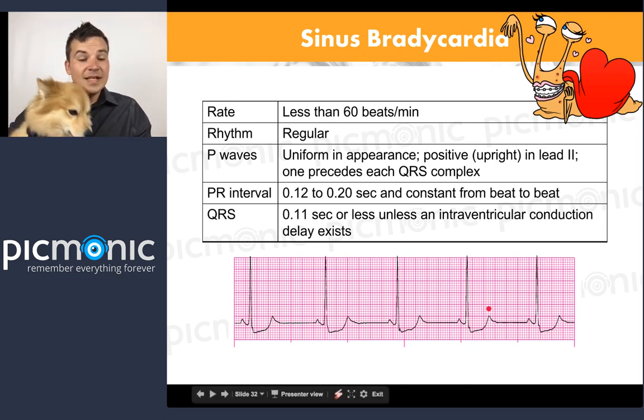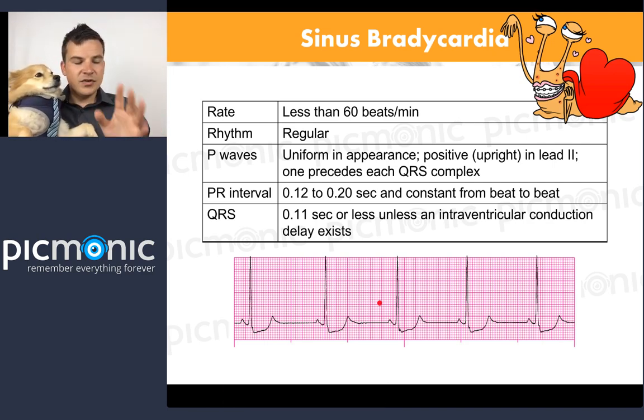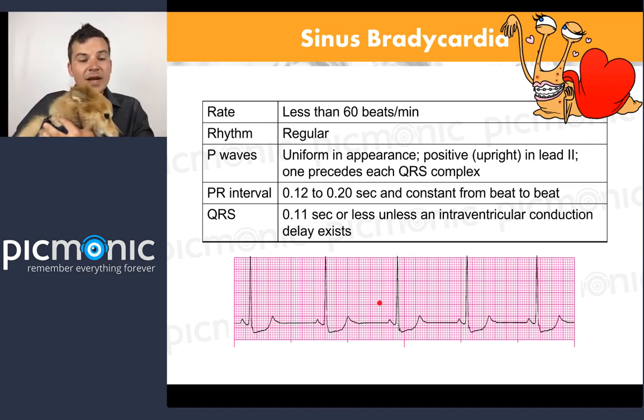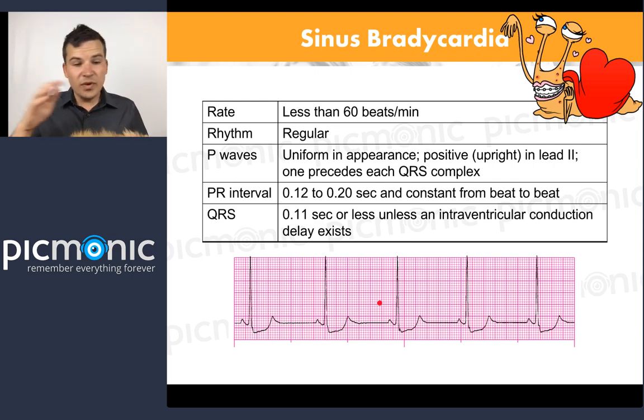So that's how I know that that's a sinus bradycardia. So Jack, for you, it's just important to make sure you know, and maybe you're answering something because there is a little bit of a delay, but what's important to think about when you say bradycardia, make sure you're always saying sinus bradycardia. Because if it's not sinus bradycardia, that's where we get into something called junctional rhythms. Junctional because of the AV junction. That means it didn't originate from the SA node. If there's no P wave, that means it's junctional. That's just a side note. We'll talk about that here in a second.